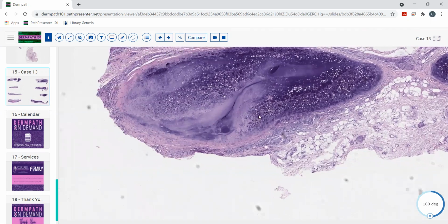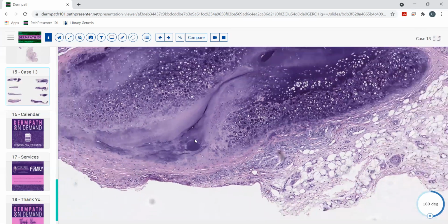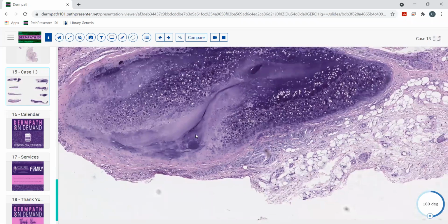Here we've got this acellular degeneration of the central part of the cartilage of the ear. And you can see that it's lost the chondrocytes. It's basically turning into this basophilic goo. And this is what we call pseudocyst of the auricle. So why do we call it pseudocyst? Well, clinically, it kind of looks like a cyst. It's a thing that looks round on the ear. And as you know, a lot of things that look round in the skin, people call cysts, so they think they're cysts.